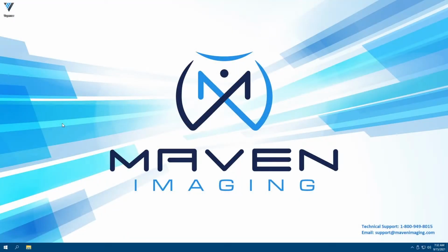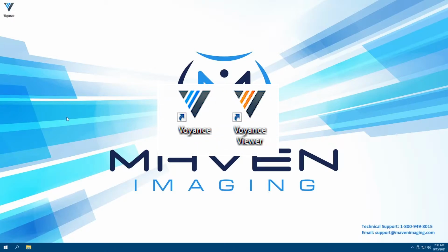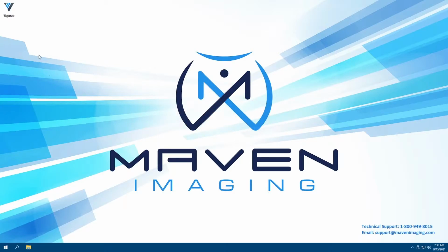Welcome to the Maven Imaging Operation Manual training for Voyance, but in video form, so that way you can learn at your own pace. So to get started, you probably have two Voyance icons on your desktop. You have Voyance, which is the main X-ray acquisition software, and then you have Voyance Viewer, which is the orange icon. What we want to use is the blue icon. It just says Voyance. So go ahead and double click.